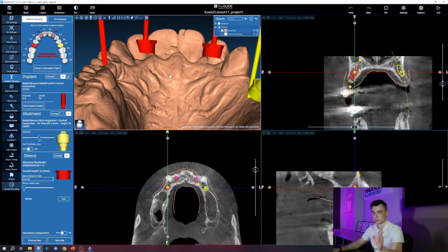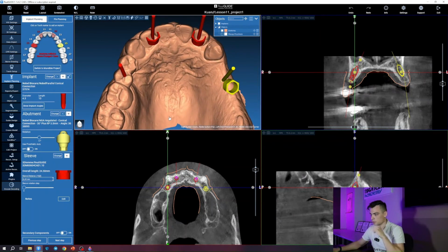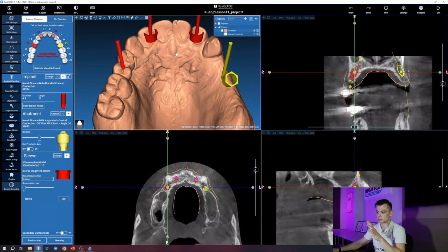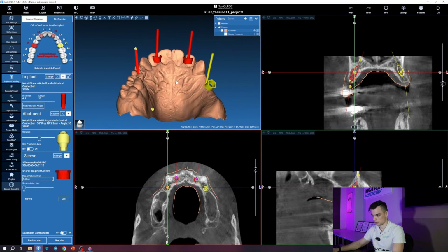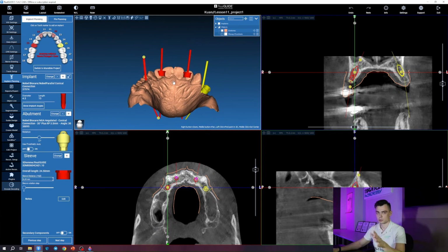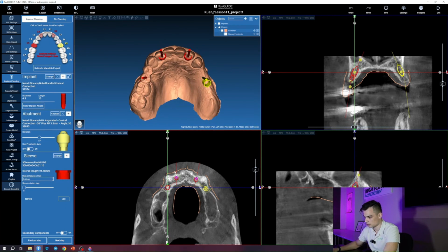By the way, we actually have on our website, specifically for this kind of situation, special navigational implant drivers with an increased offset. That is, an extra 3 millimeters have been added to these drivers. And with a standard navigational implant driver, it's unlikely that you'd be able to do this kind of work. But with our navigational implant driver, you'll be able to do this work. Just so you know, I want you to be aware that there are tools that allow you to work here with a navigational implant driver with an increased offset. But in any case, this doesn't directly relate to this particular case.